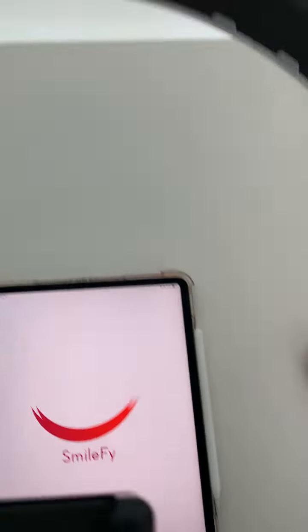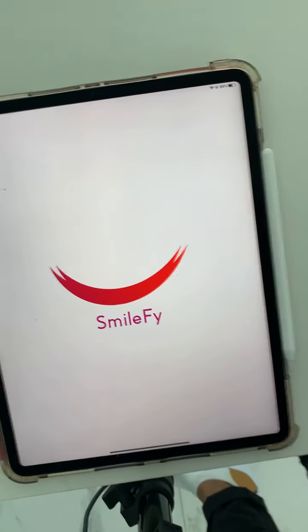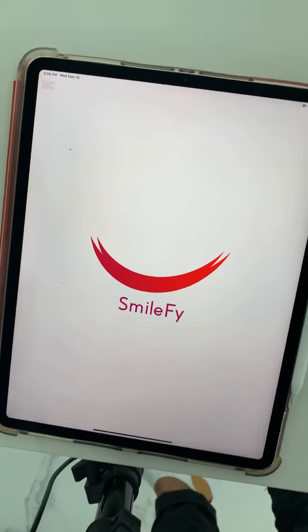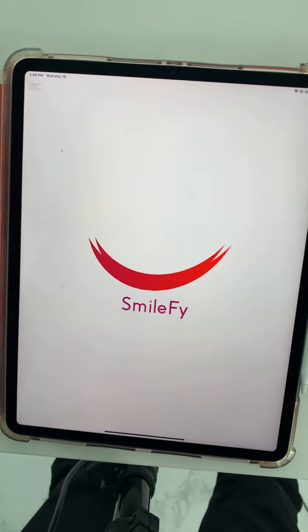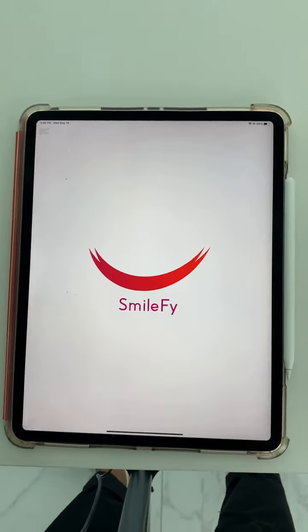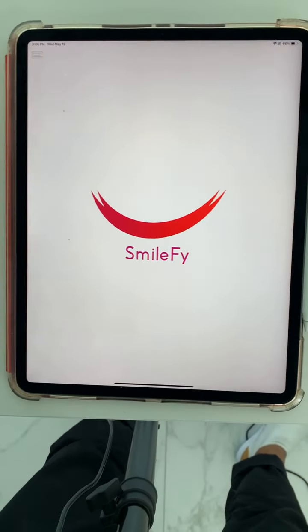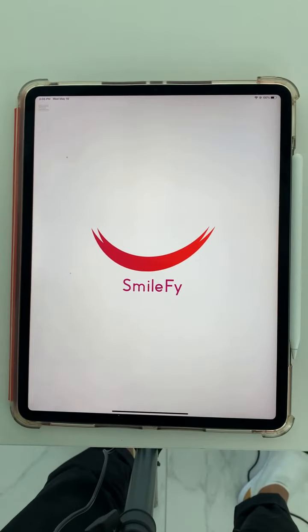So let me grab here, and I'm going to show you guys how to calibrate an STL over your design, as well as how to add measurements and how to do your analysis. Okay.